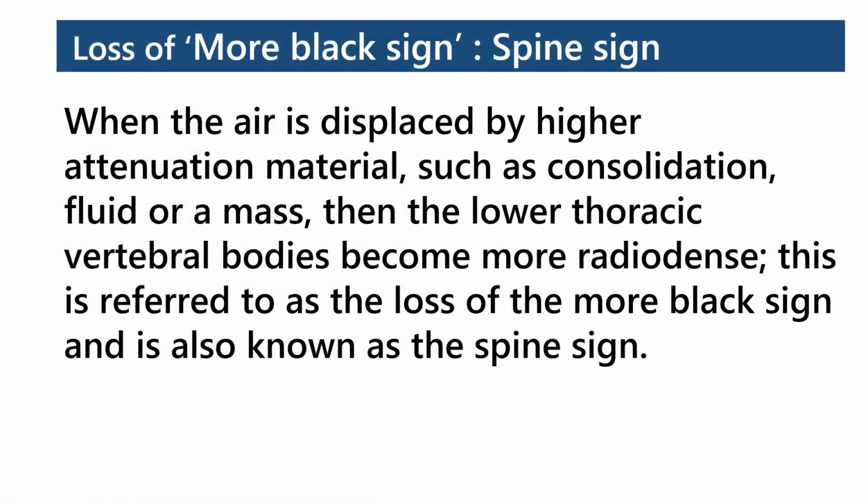When the air is displaced by higher attenuation material, such as consolidation, fluid, or a mass, then the lower thoracic vertebral bodies become more radio-dense. This is referred to as the loss of the more black sign and is also known as the spine sign.